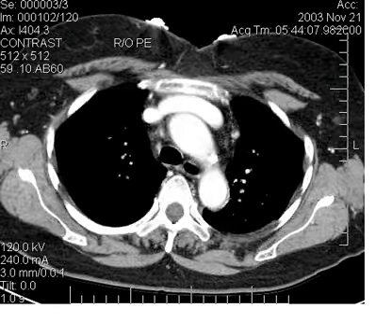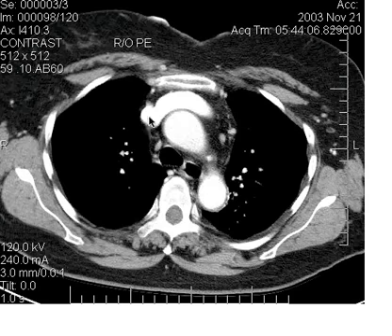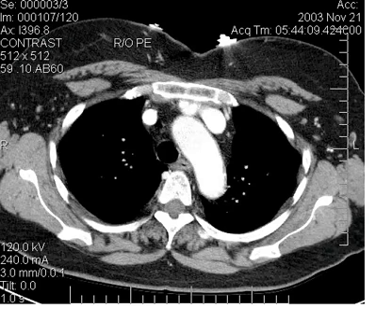And this patient has good opacification of both the left and right brachiocephalic veins. So as we come into the superior vena cava here, we won't see the mixing that we did before of opacified and unopacified blood. Back to the aortic arch here. This is the aortic arch.